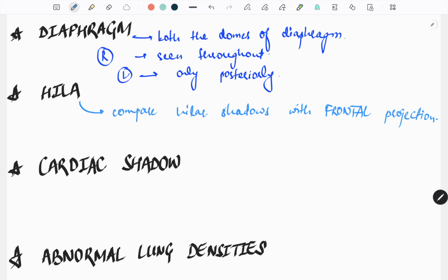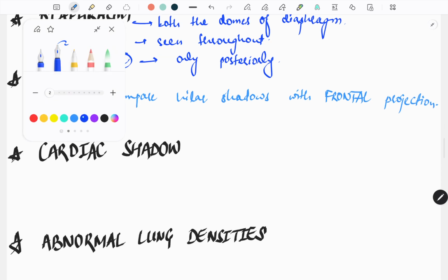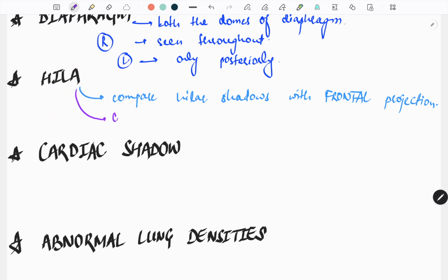Why so? Because both of the hila are overlapping here.